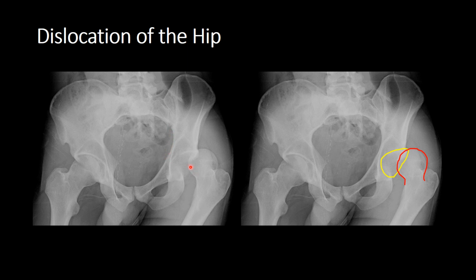Although this X-ray quite obviously demonstrates that the femoral head has not displaced centrally, you should still check carefully to make sure that there's no disruption to the acetabulum. As this case doesn't feature an associated fracture, the patient will need to have knee X-rays to exclude a more distal fracture.